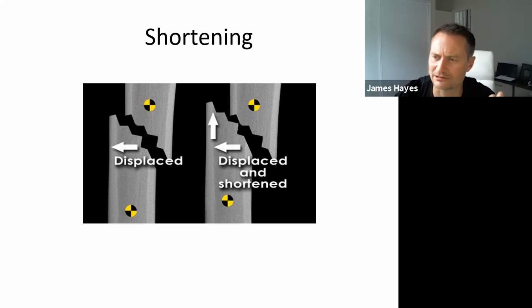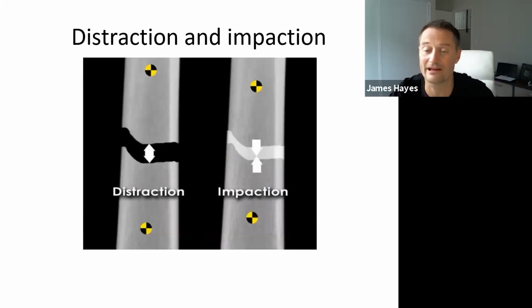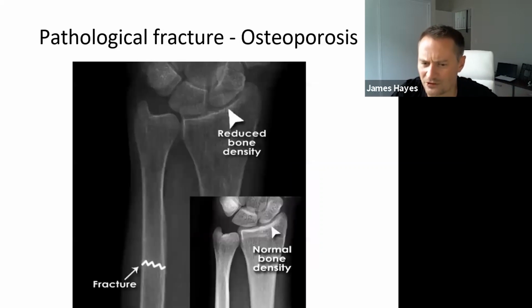Student radiographers love this. What does a fracture look like? Oh, it can be white or black. Like, great, thanks. Angulation, rotation. Again, you just describe what you see here. I'm speeding up a little bit, and there is an exact example of what I was talking about there. So just because I'm showing you slides now, I'm not spending a huge amount of time on them.